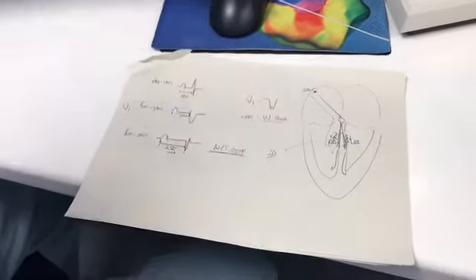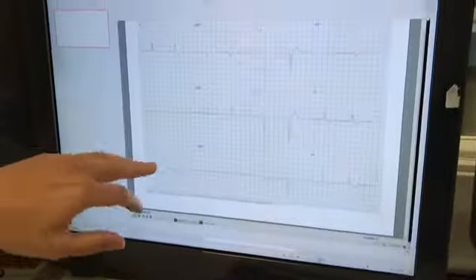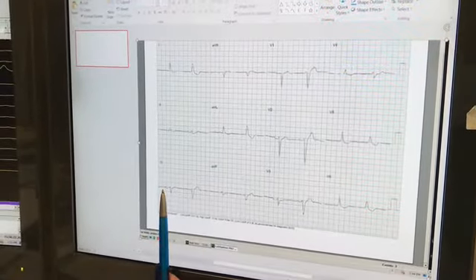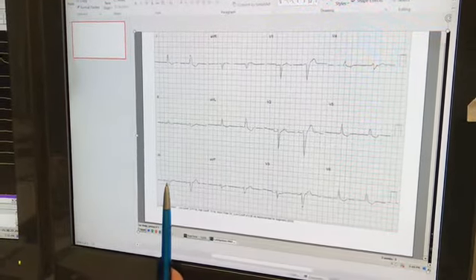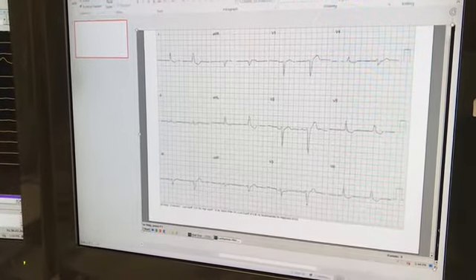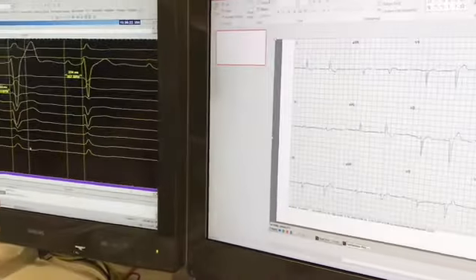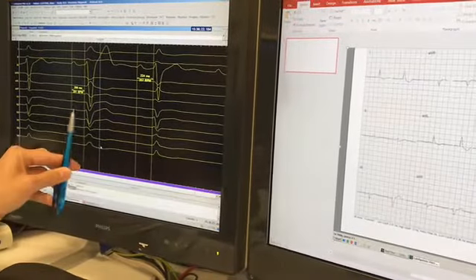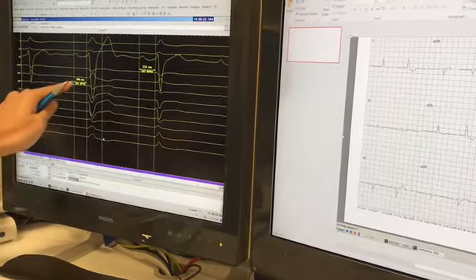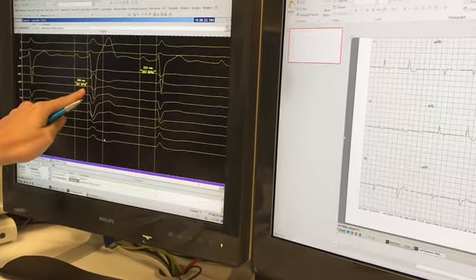So we come back to this patient and we try to explain this dynamically in a wonderful example of this occurring, where you get a narrow and a broad alternating pattern. And actually it's proven now, if you switch over to this view, that this is exactly what happens. With the broad left bundle, you have a PR interval of 206 milliseconds.